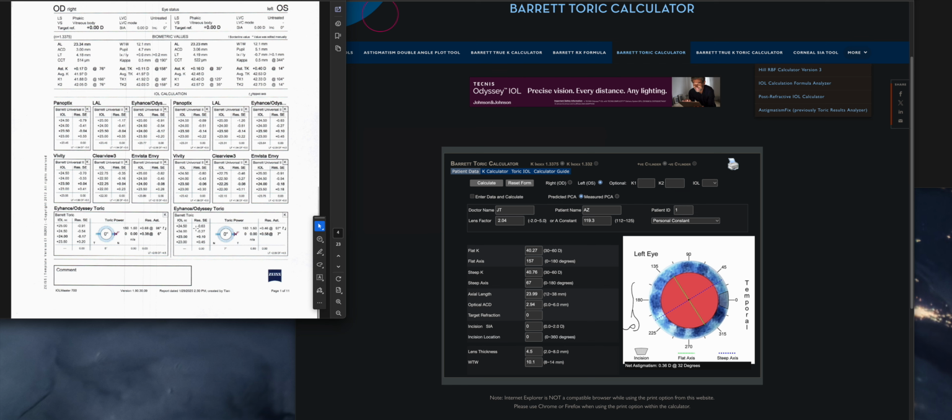That is no problem and should perform just fine. It has a very, very flat peak to the defocus curve, so that's good, and it can tolerate a lot more plus and more minus both ways for the distance vision.